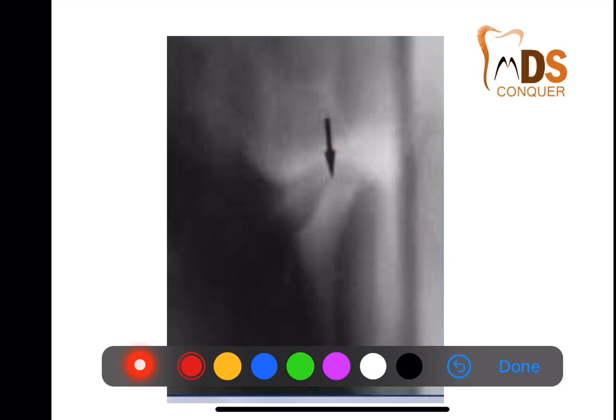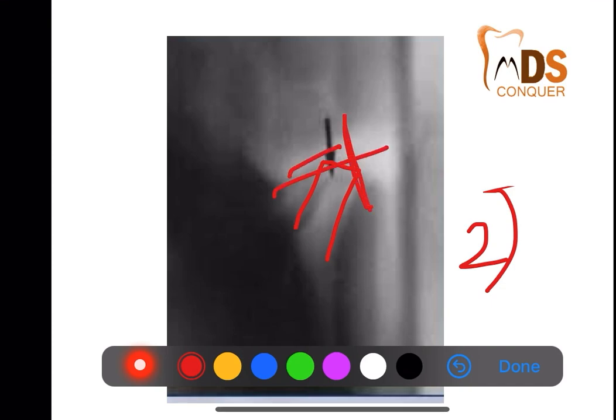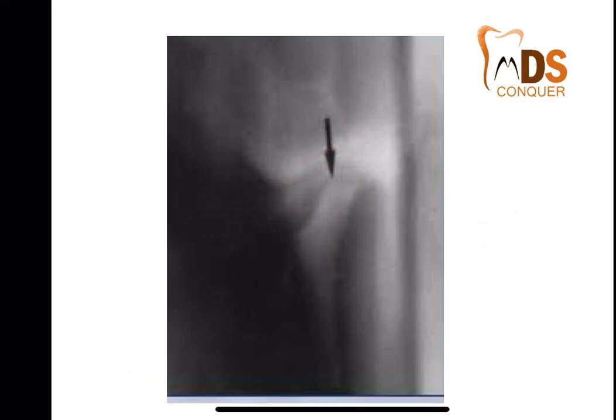So with the second step itself, you can see that the shape of the condyle is not normal and it is sharpened. So it is a sharpened pencil appearance. It is clearly rheumatoid arthritis. They can simply post a picture like this and ask you to arrive at the radiographic diagnosis. Then you have to go for rheumatoid arthritis, because of the sharpened pencil appearance. So this is again related to the TMJ, which is quite important.